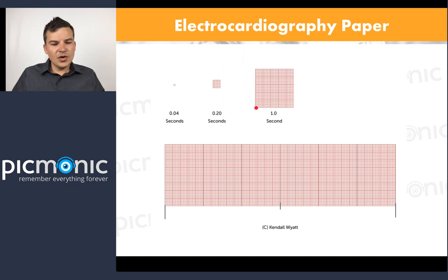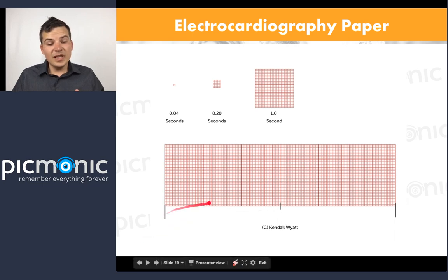So what's really cute is that at the bottom of every paper, there are lines that jettison down from the bottom, and they're usually little black lines. Now, there are variations in this, yes, but these little lines are usually at 3-second intervals, and then they jump over. So that's 3 seconds, and then that's 3 seconds.